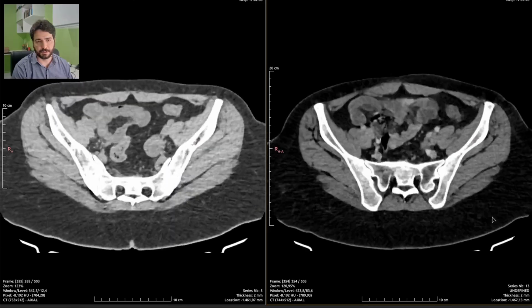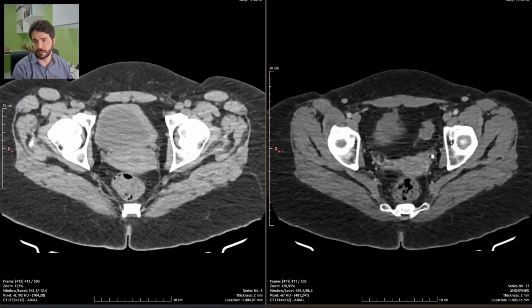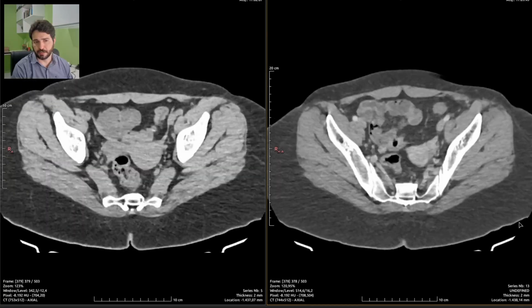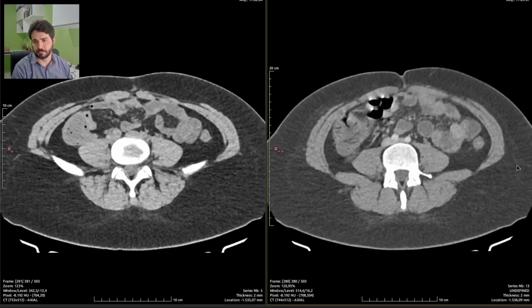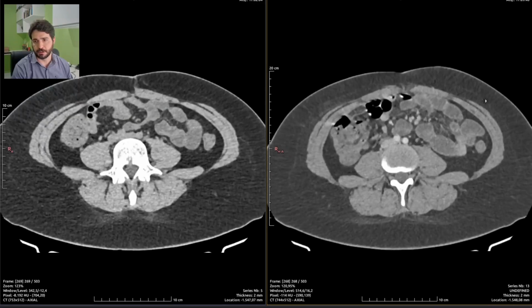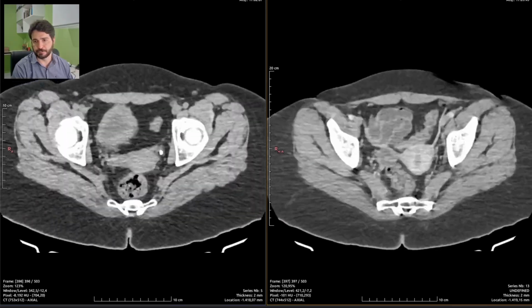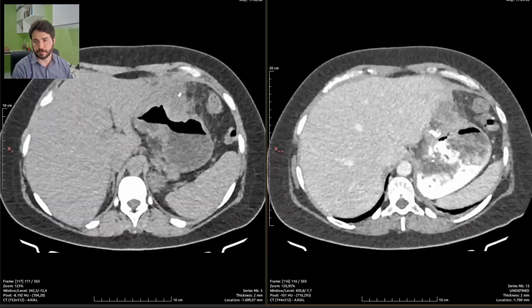So this patient is still obese, and got her gastric surgery reversed. I don't get it. And she didn't hold her breath. There are a bunch of artifacts. This is a tough one.